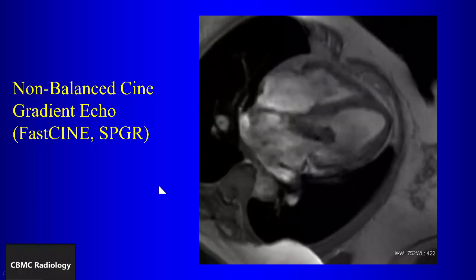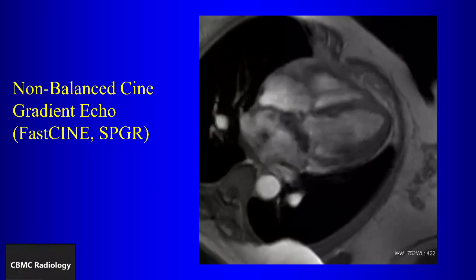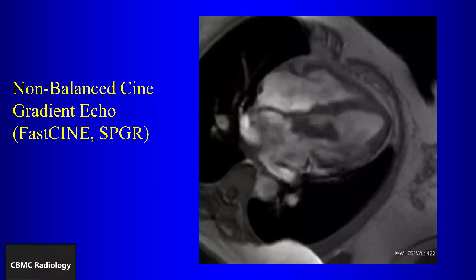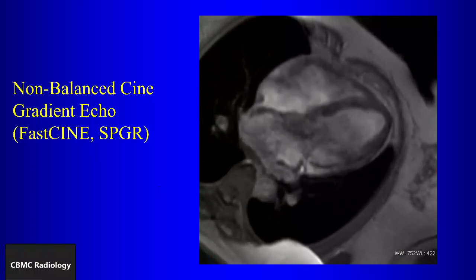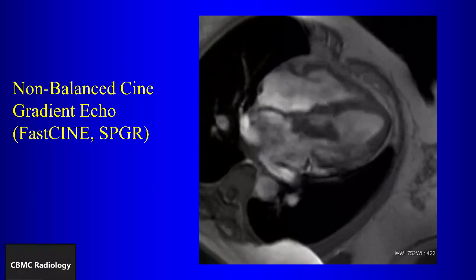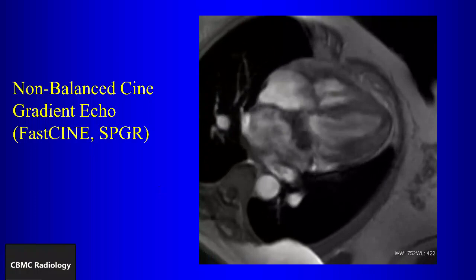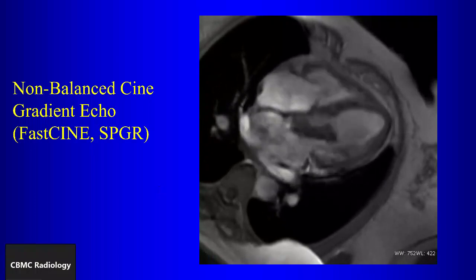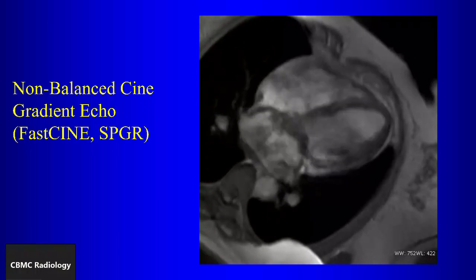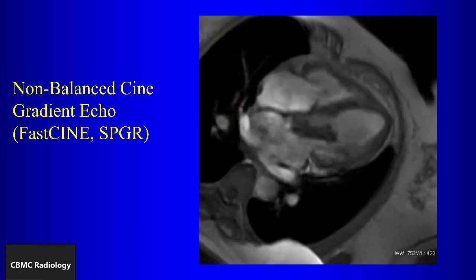Now, a few reasons why the tumor shows up better. First, the signal characteristics are different. So for SSFP, the signal characteristics depend on what? For SSFP, what determines the signal characteristics? The T2 to T1 ratio. The ratio of the T2 to T1 times determine the signal characteristics on SSFP. So here, you could see it better.